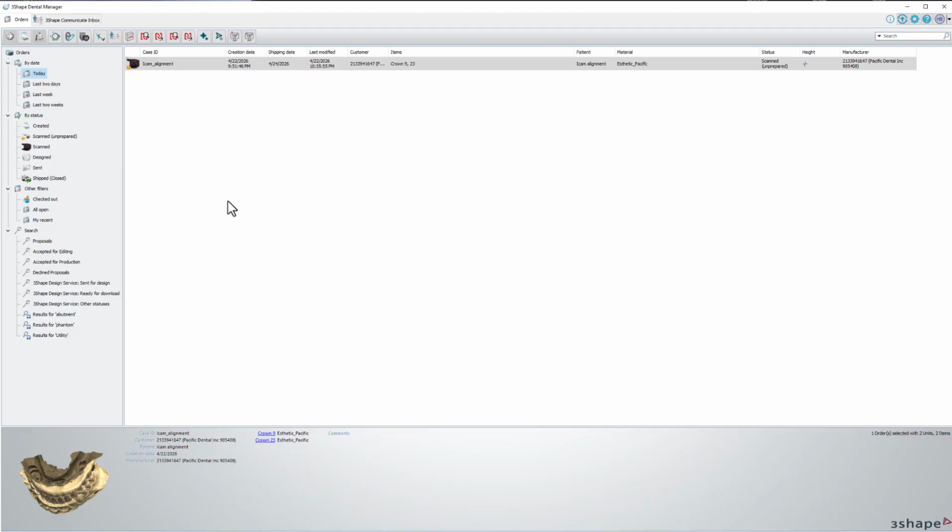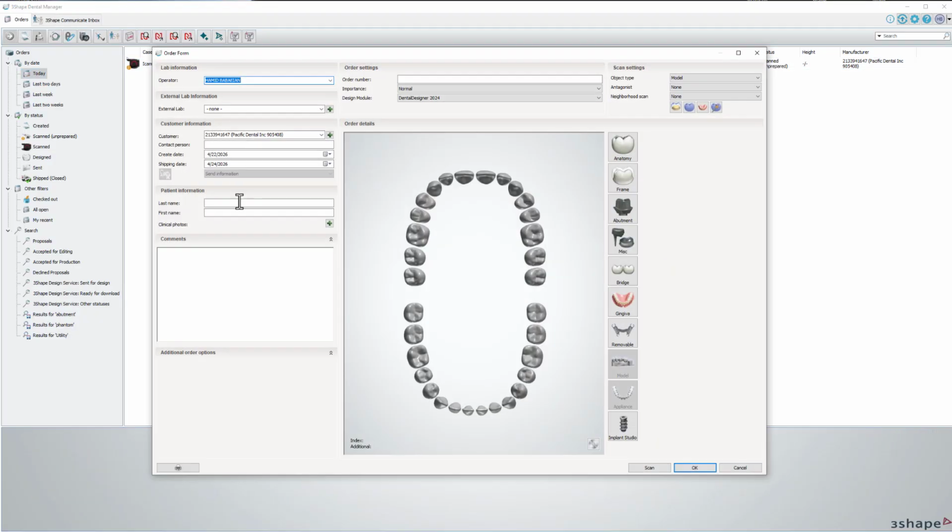But when you have a double upper lower case, no matter what I did, I could not get the implant information to inject into the order for both arches at the same time in one order. So I said, if it works individually, let's make one for each. So unfortunately, this is the side for 3shape that I guess is the setback.